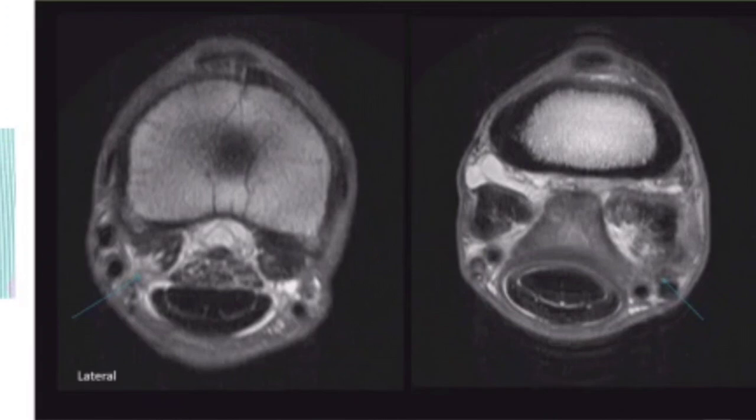So this lateral oblique sesamoidean ligament is also quite abnormal with a lot of fiber disruption along the palmar abaxial aspect. The person who had done the ultrasound was pretty upset because she's a fairly accomplished ultrasonographer, and she wasn't really sure how she had missed this large tear in the oblique. So again, as I said, we always want to try to learn from what MRI teaches us, and whenever we can, ultrasound before and after.